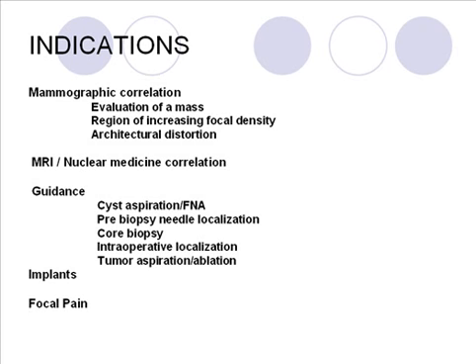The most fun we have with ultrasound is when we use it for mammographic correlation. We see something on a mammogram, whether it's a mass, a region of increasing focal density, architectural distortion, or some other change from comparing with previous years. And we will use ultrasound to help us, because sometimes you can do bunches of additional pictures and spot compression views, and I'll show some pictures of that later, and you still aren't able to figure it out, where an ultrasound can help you characterize that region as being something suspicious or something not to worry about.